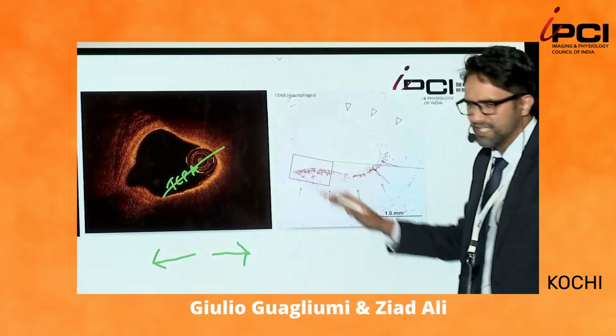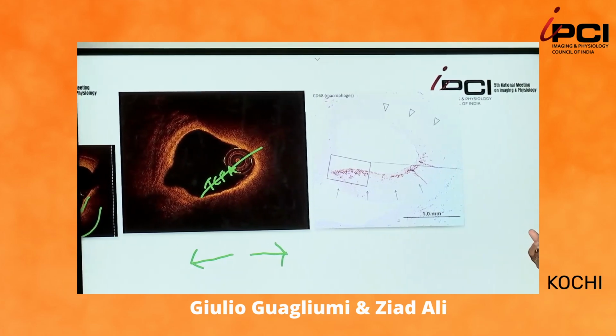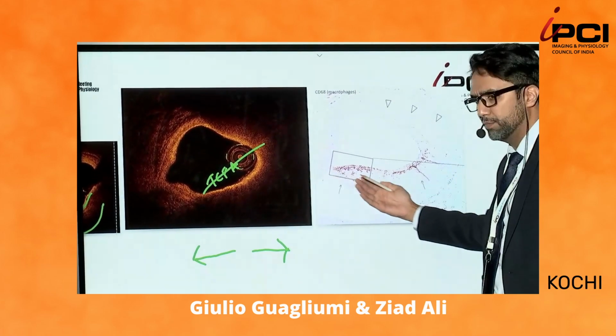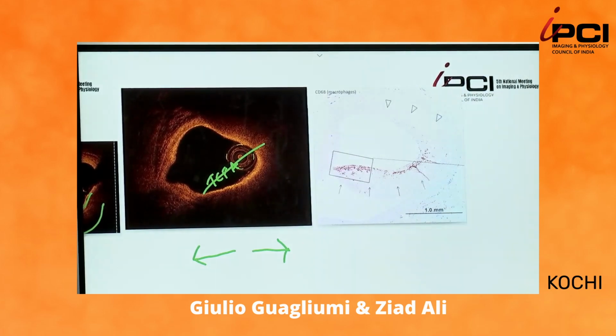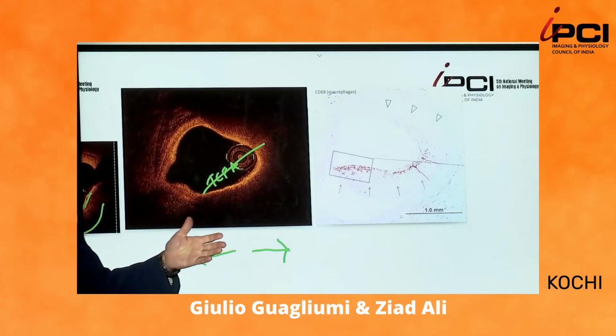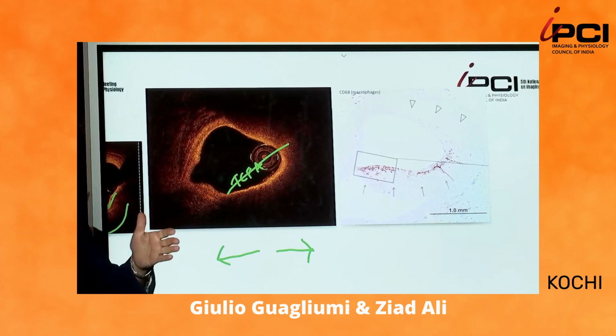So when we see something on a screen and we're going to be making a clinical decision on it, it behoves us to move just before and just distal to ensure what we're looking at is what we really think it is. This is valid for many situations. Eroded plaque is something that is not standardized, and you can be in trouble. Sometimes you see that it could be eroded.